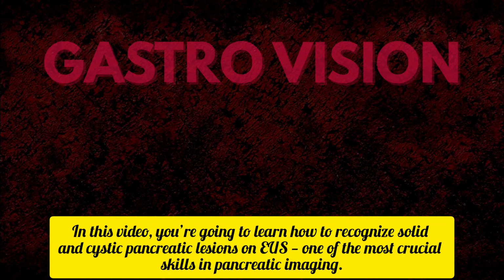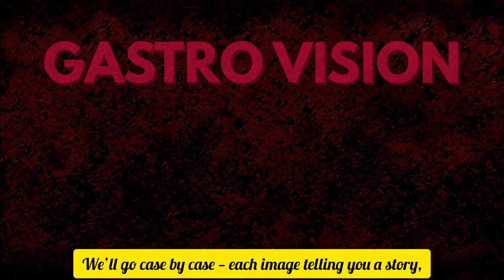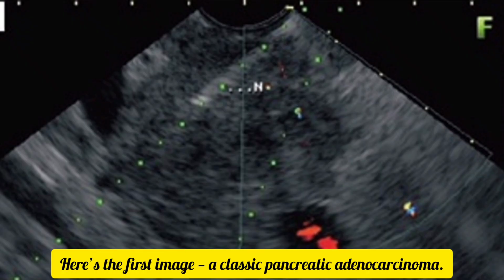In this video, you're going to learn how to recognize solid and cystic pancreatic lesions on EUS, one of the most crucial skills in pancreatic imaging. We'll go case by case, each image telling you a story, and each pattern helping you master the art of interpretation. So let's begin. Here's the first image, a classic pancreatic adenocarcinoma.